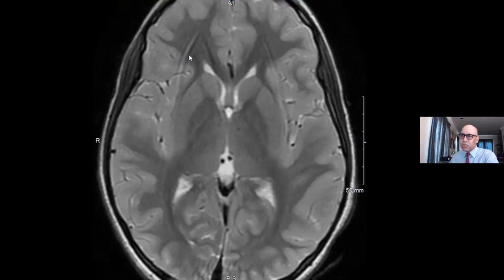This small amount of motion artifact is actually, I think, an acceptable amount of artifact that allows this child to have an MRI scan without needing sedation. I think it's worth that. We won't miss anything if we look carefully at all the sequences.